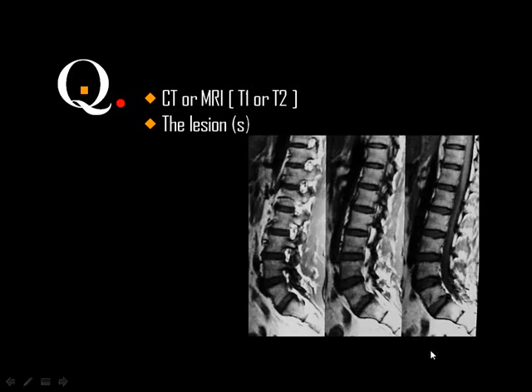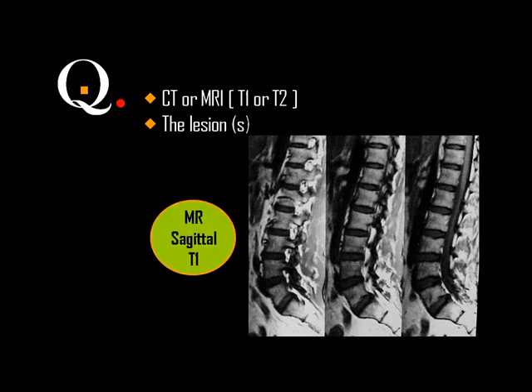What do you think about this? MRI. Which part? T1, lumbar spine, sagittal view. Do you see a pathology? Canal stenosis is judged in the midline image, and you see adequate CSF space, but be careful. You should judge for canal stenosis in the T2 weighted image, where the CSF is bright, then you can see the nerve roots and you can see everything in the anatomy. Okay? Then this is a normal lumbar spine.